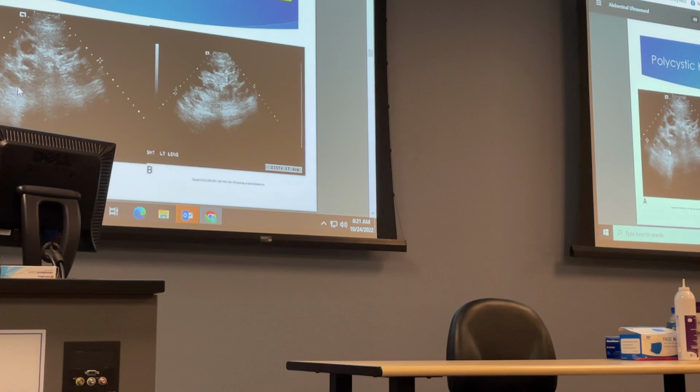Next we get into polycystic kidney disease. If I were to give you an image that is completely covered with cysts, like any of these images, remember that is polycystic kidney disease. Again, in both of these images, you can see all of these cystic structures taking over the entire renal parenchyma. The actual renal parenchyma gets really difficult to visualize, and all you see are cysts.